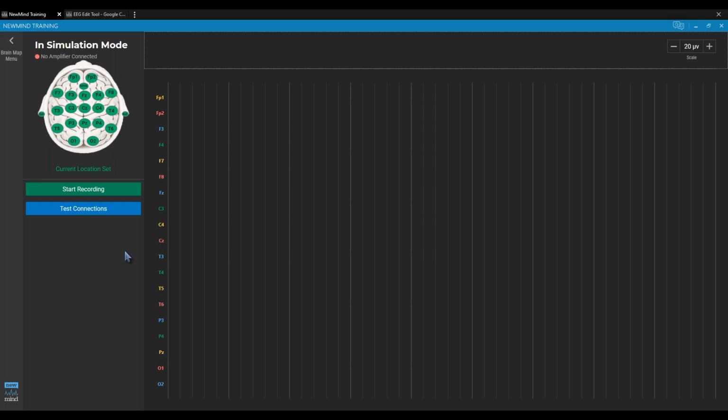It wasn't stopping and then starting again in 3 seconds. It was stopping for 5 or 10 seconds or something, and I could see some of the issues on the screen. So it wasn't some kind of technical error or something. I could see changes.